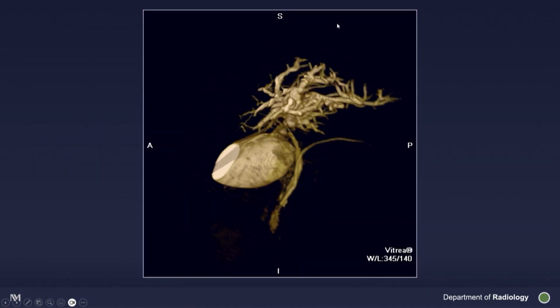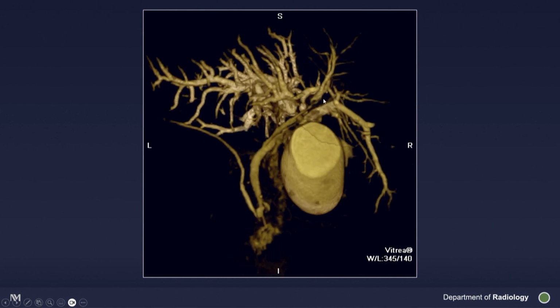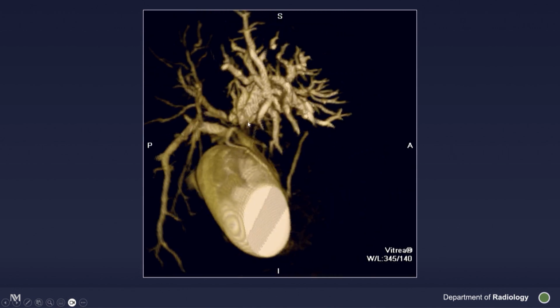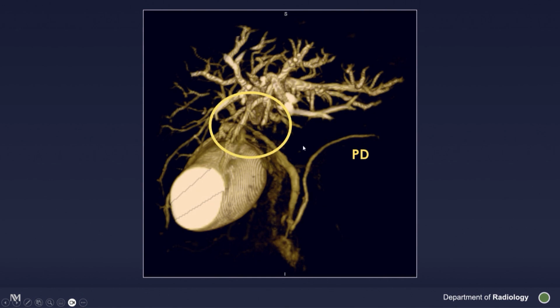And then you can obtain a 3D MRCP, and you could beautifully see the presence of the intrahepatic biliary dilatation, the presence of a tight stricture, as illustrated here, so you know that there's something going on. This is somebody with cholangiocarcinoma, a Klatskin tumor.